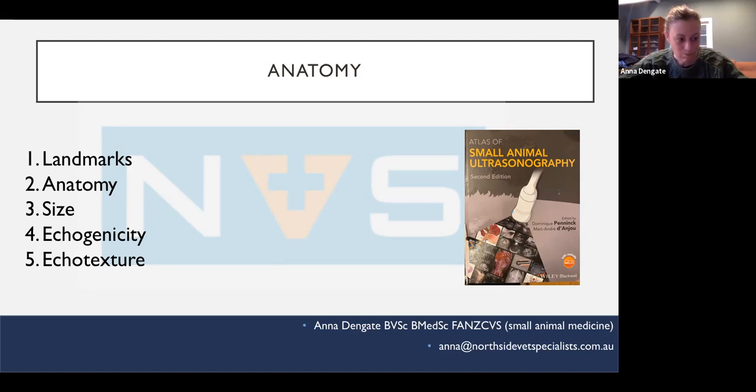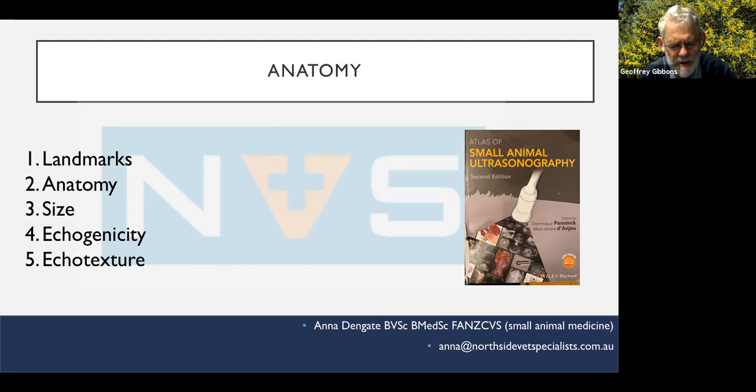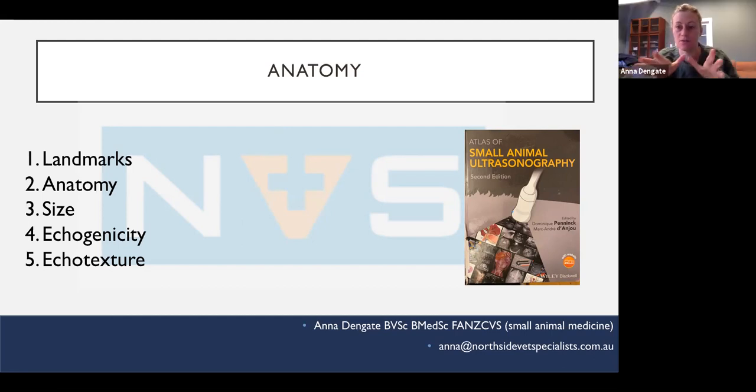Right kidney. Excellent. Bonus points for telling me which lobe contacts the right kidney. And the pancreas and duodenum, pylorus. Yeah, absolutely. So they all sit up, the liver almost wraps around them.